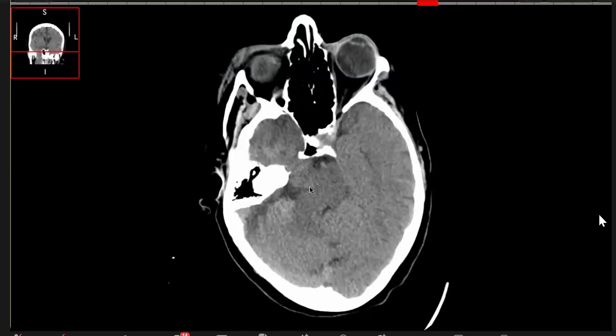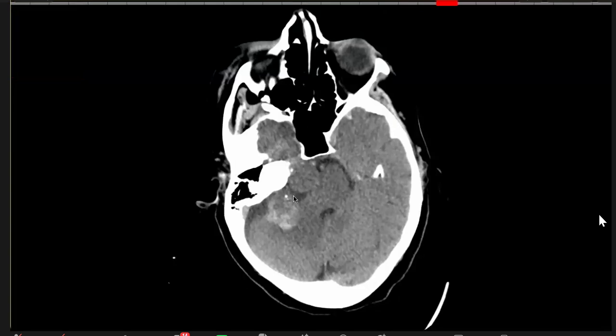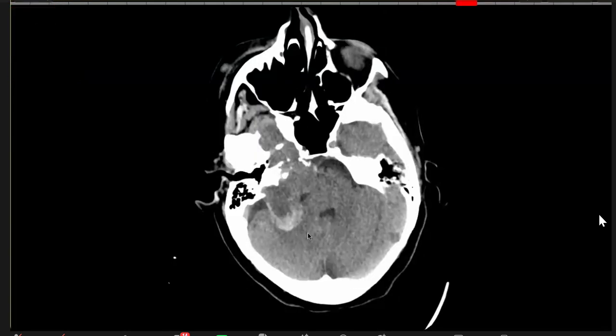So I am also again going down. There is another lesion involving the region of the right petrotemporal region, in the posterior cranial fossa, vestibule. There is also lesion extending into the petrous apex, and this is extra-axial. It shows internal regions of high density.